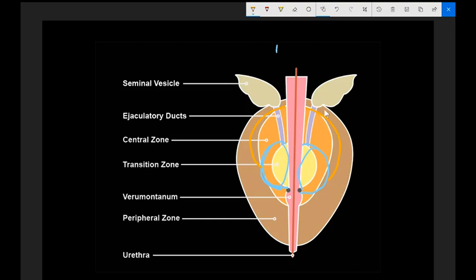What makes MR so valuable, though, is not seeing this area, but seeing this area down low, which is so hard to analyze by physical exam and even by visual inspection and biopsy. It's just a hard area to get to. And a lot of cancers occur down here. Most radiologists don't think to look down here. And also anterior in this area is where the fibromuscular zone is located, which is dark, and cancers are dark. So you have to really tease out what's normal tissue and what's cancer, and you use the diffusion image to do that. I'm not going to talk about the actual zones.